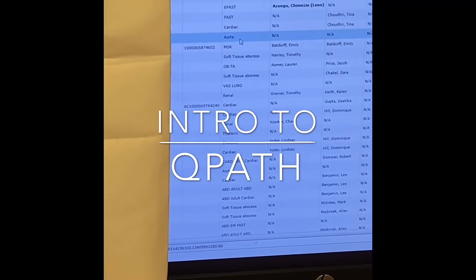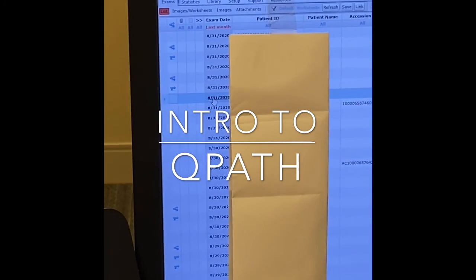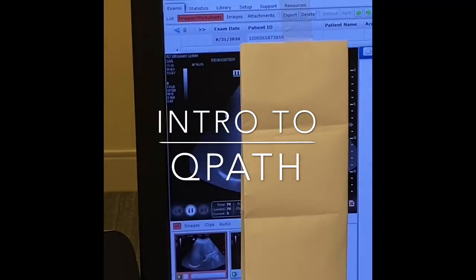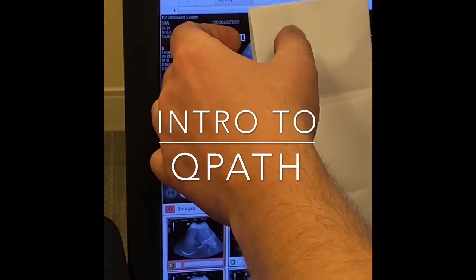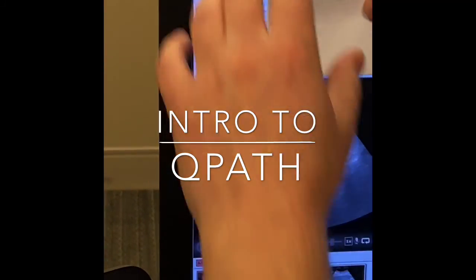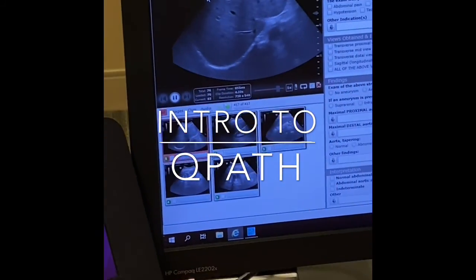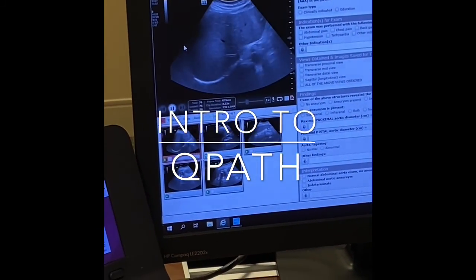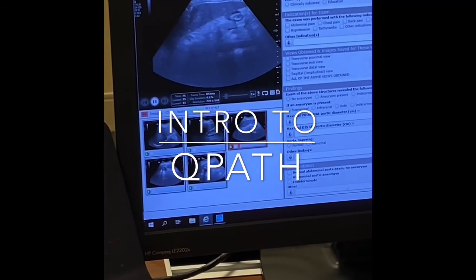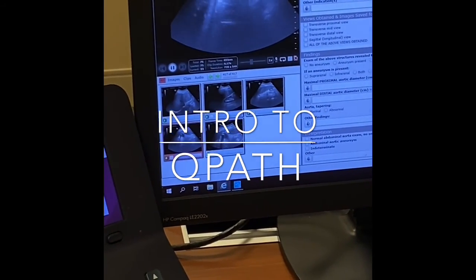If you want to open the exam to view the images, you click on the date of the exam and you could see that the mouse pointer changes. If you click on it, you will see that we have thumbnails here and the image. I can go through the different thumbnails for them to pop up on the screen.